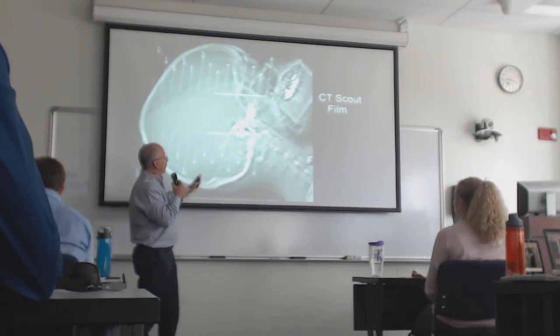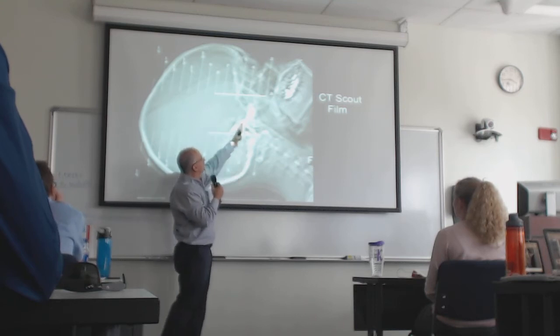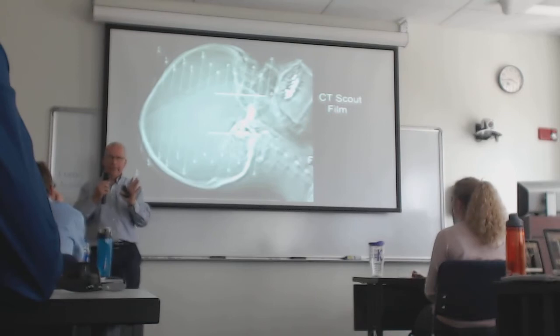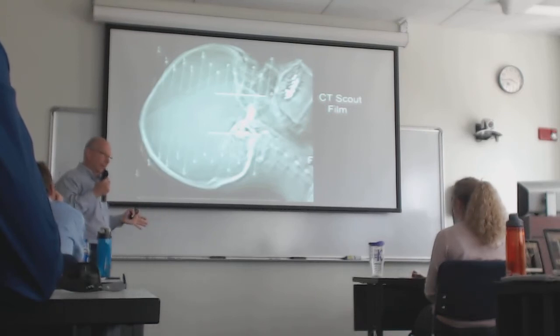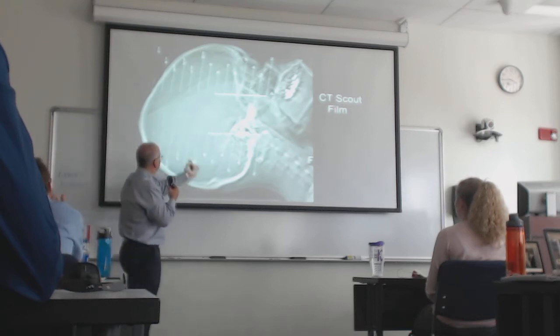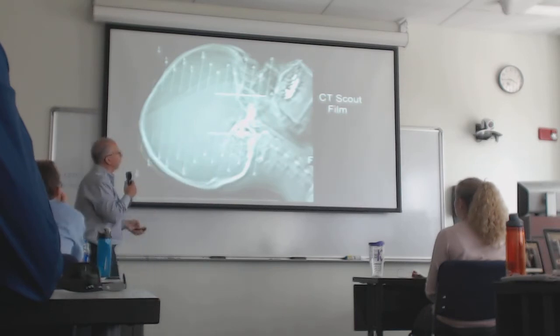The slices are generally oriented toward this line through the base of the skull. Most head CTs, the CT techs know to orient these the same way. It's not always done because patients are kind of moved. Sometimes they're moving, sometimes they're impossible to get on the scanner properly. But we have a general idea of the plane of section. So it's not like we're doing it this way, right? We're always doing it this way, which is predominantly in the axial plane.